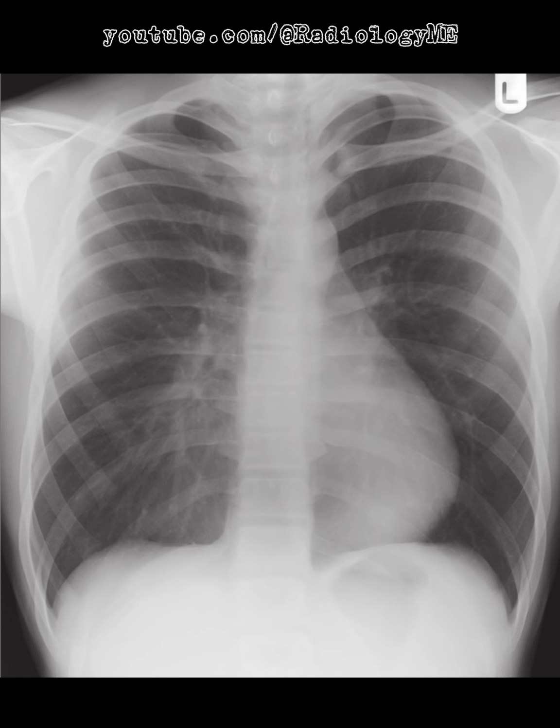To further clarify, I'd request a lateral chest radiograph. That would help confirm whether the antero-posterior diameter of the chest is reduced, which is classic for pectus excavatum. Additionally, I'd inquire about any clinical symptoms like dyspnea or chest pain, which could indicate cardiorespiratory compromise. If the patient is symptomatic, I'd go ahead with an echocardiogram or pulmonary function testing to assess the functional impact of this deformity.